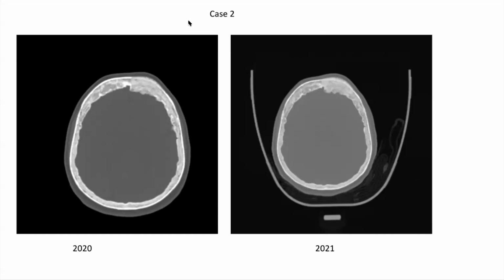Let me just show you how you should approach this lesion. The first thing I want you to notice is the vertical lines that you see here. They're a little faint, and I realize you're not looking at this carefully on a PACS monitor, but this kind of appearance, which people describe as hair on end, should suggest a malignancy. Usually this is a periosteal reaction.